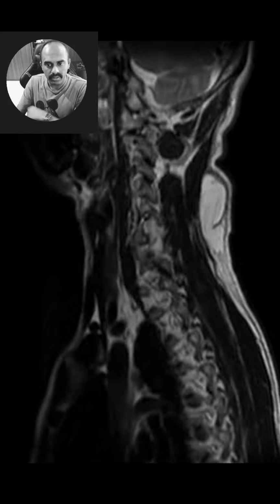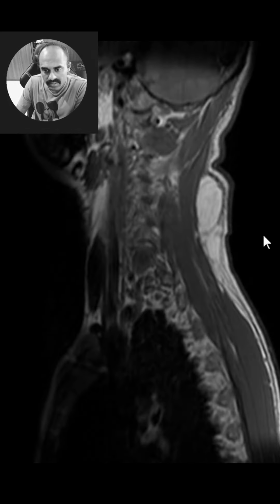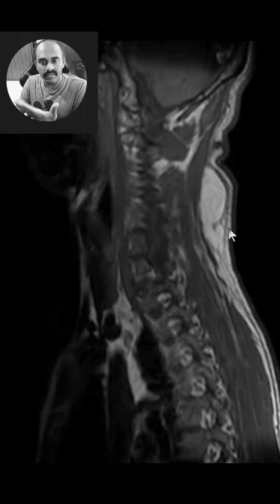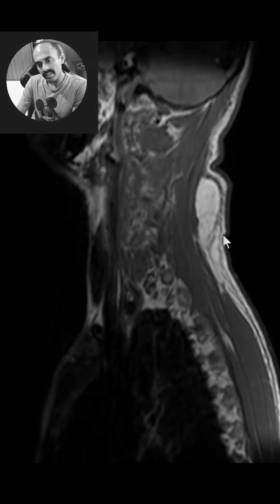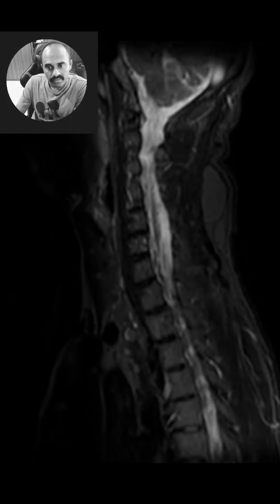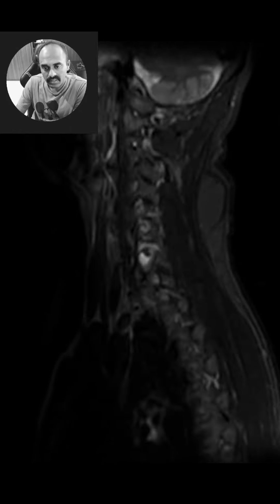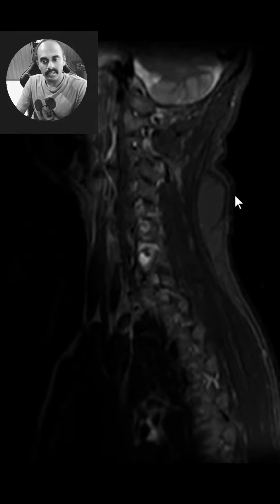to the subcutaneous plane. Now if I switch over to T1 weighted image, you can see the same thing. It appears fairly homogeneously bright, the contents, while the septae within appear hypointense. Now I'll go to a fat suppress sequence. So a STIR sequence over here demonstrates that the lesion is completely suppressed. So this is a fat containing lesion on the posterior nape of the neck.